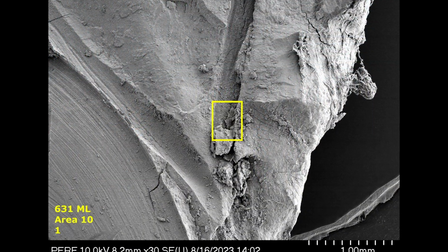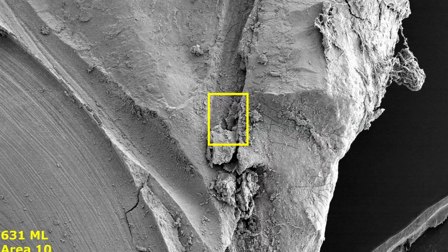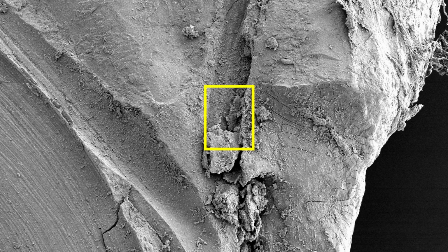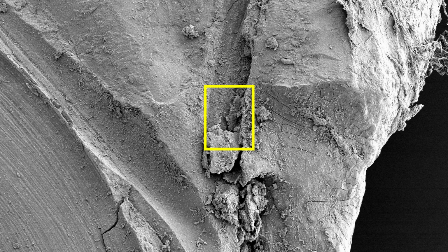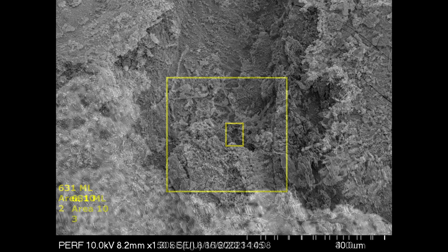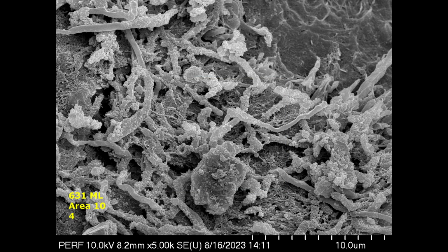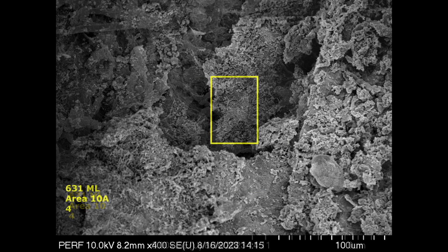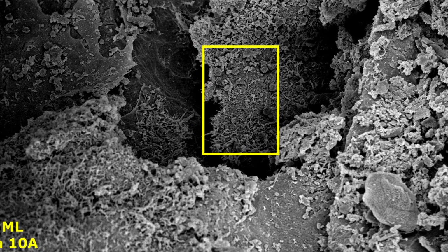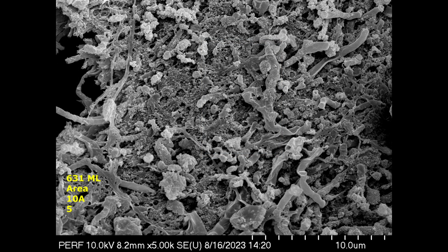When you examine the area where the canals coalesce and where there appears to be pulpal tissue, we're going to ignore this tissue for a moment and examine places where we might get a glimpse of the mineralization front on the dentinal wall. And when we examine that, we see what can only be interpreted as a biofilm with many bacterial morphotypes. In the adjacent area, you can infer this is just part of a much larger and widespread biofilm interspersed with debris from the demineralization of the predentin.